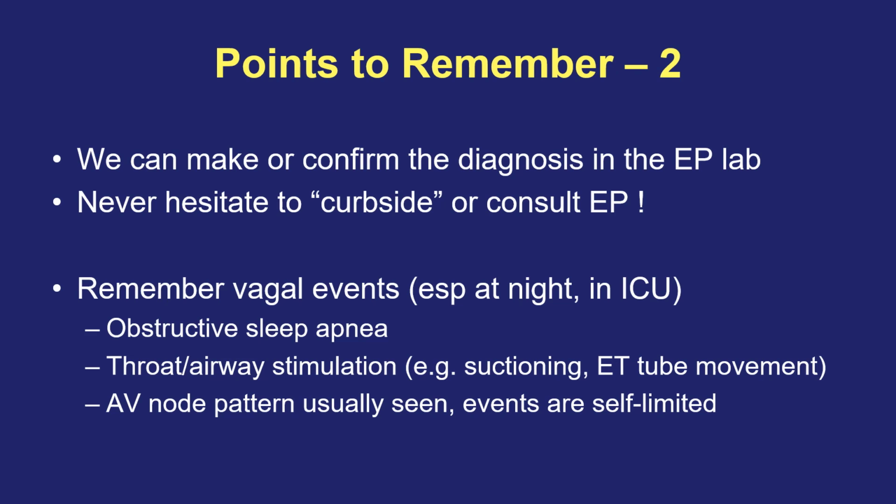These events are usually self-limited, do not individually require attention, although if they're very frequent and they're interfering with the patient's care, then sometimes a temporary pacing system is placed, or even permanent pacing. It depends on the specific patient situation, what the impact of these events are, how frequent they are, etc. But it is important to obviously make the correct diagnosis so that you can figure out what is the urgency and what might be the appropriate treatment.